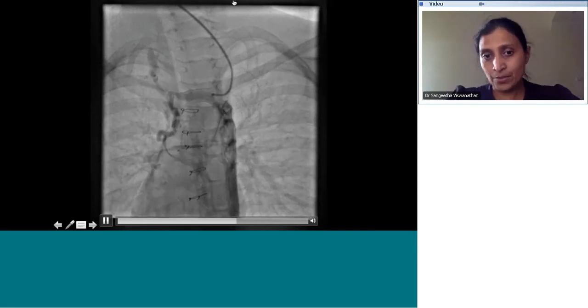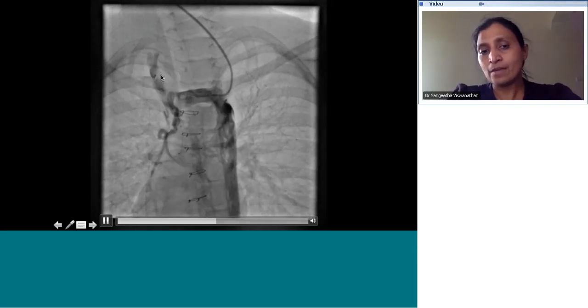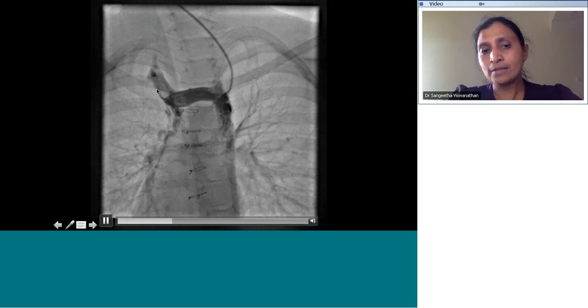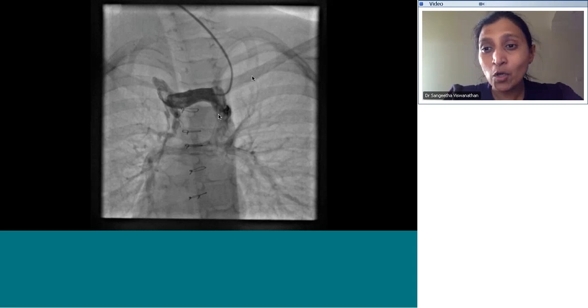The same patient, okay? So what is this structure that we are filling here? What is the structure that we are filling here? MIOT? Not entirely sure.